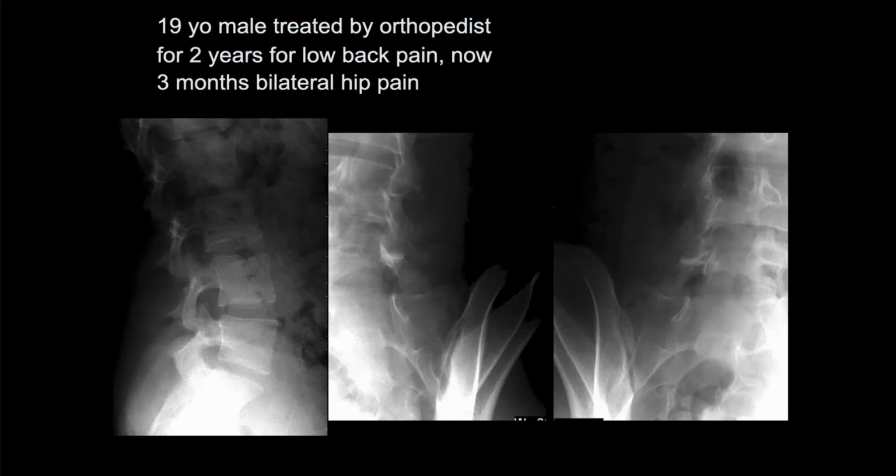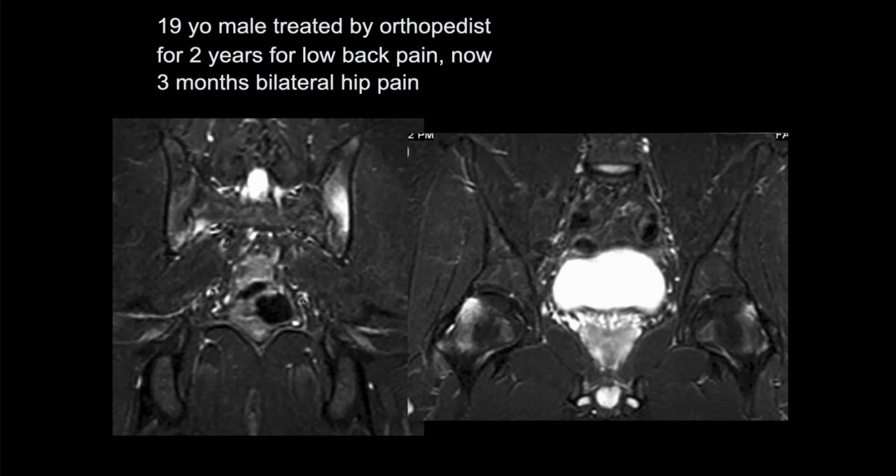19-year-old male treated by an orthopedist for 2 years for low back pain, now 3 months of bilateral hip pain. So you get some obliques of the SI joints and a lateral, all radiographs. I think they're pretty unremarkable. Okay, so I guess you want an MR scan. Yes, sir. Well, those are the proper x-rays to take with this disease to see the sacroiliac joints the best.